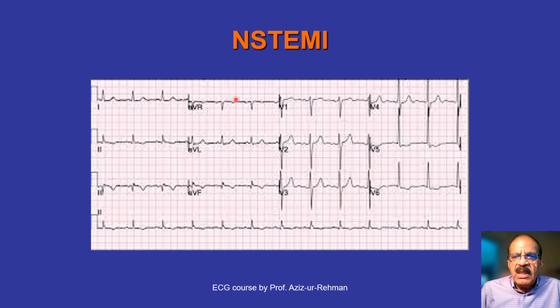Still another patient, chest pain. The rhythm is okay, and there is no ST segment elevation, but there is ST depression here. In the proper history, if the patient gives history of resting chest pain, with a specific phenotype of the patient and the risk factors, then I think even these subtle changes should be interpreted as possible acute coronary syndrome.